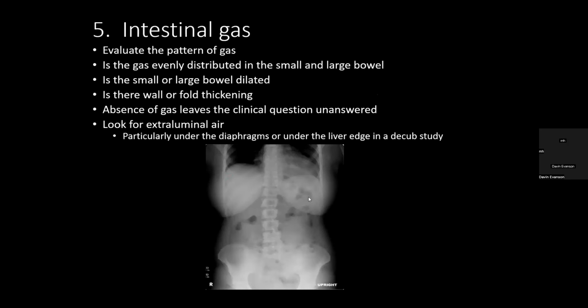It's bowel gas, normal or abnormal. We have to know how the film was taken. A lot of burps and farts. Was it upright? Sometimes it will say you'll have air fluid levels, or supine, because free air and obstruction will look different whether the film is taken upright, supine, or lateral.